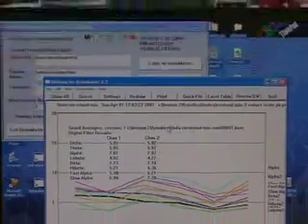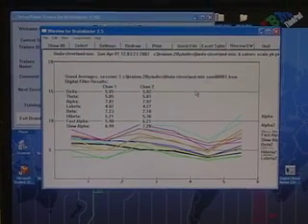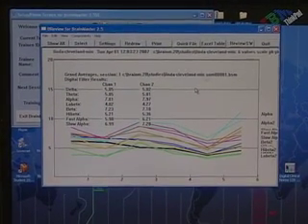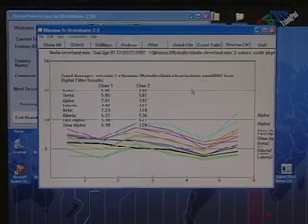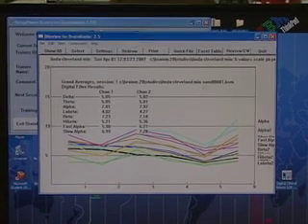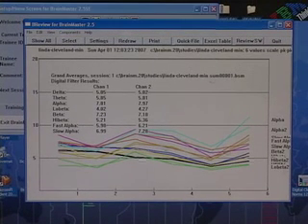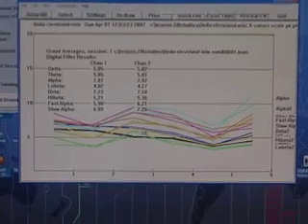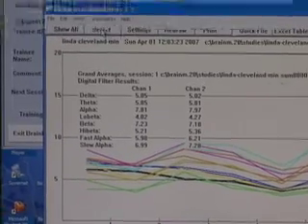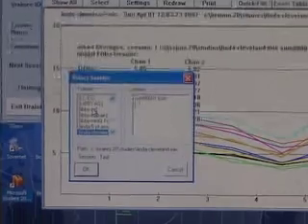As you review session results, the next thing you need to make sure of is that your BrainMaster software is working properly. Now, this is a MiniQ file. This is an example of a good MiniQ data recording. What I'd like you to do is just select any training screen that you ever did.